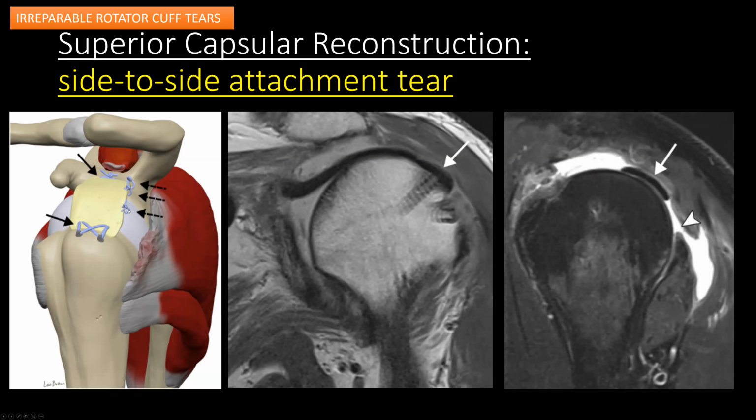So when it comes more lateral, if we see any gap between the graft and the muscle or tendon, we tend not to call any tear. But close to the glenoid, if the side-to-side attachment was done and there is a gap, we try to highlight that in our report.